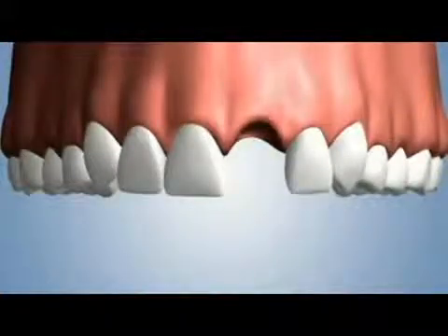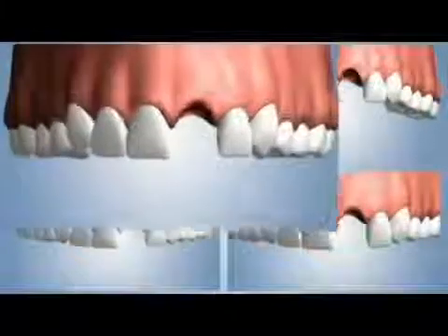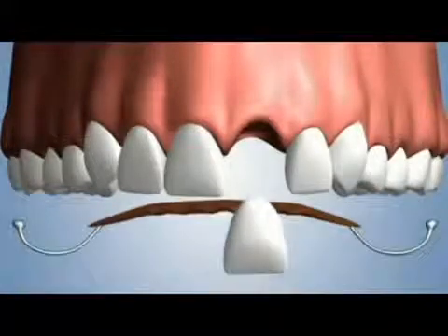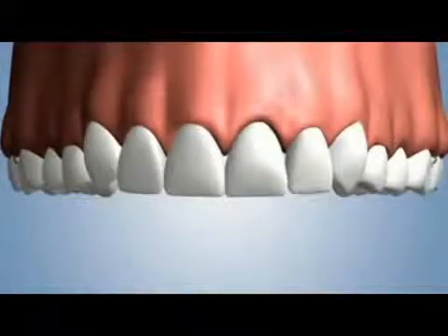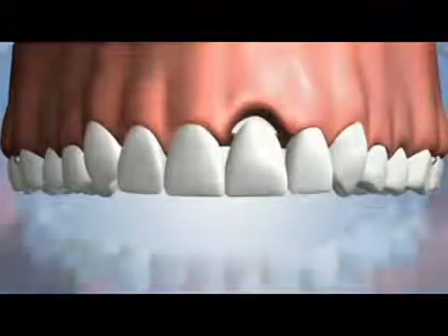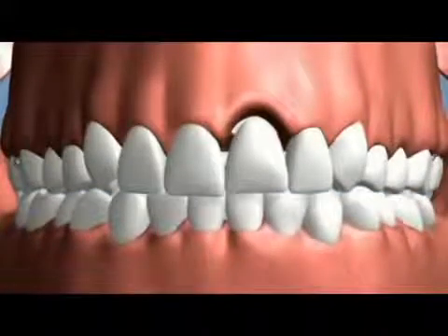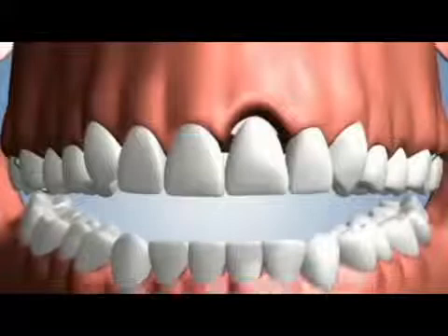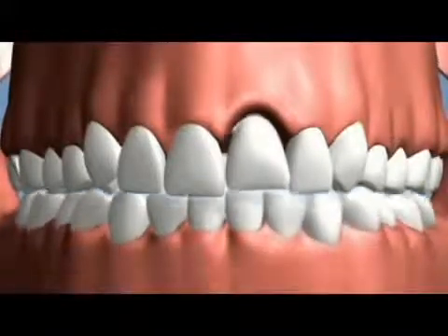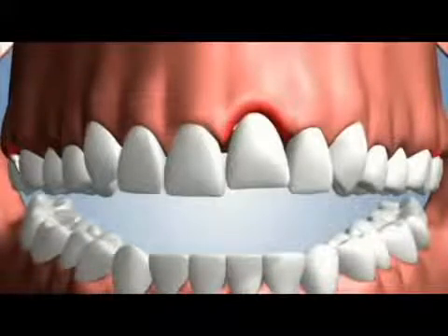If you have lost a single tooth, you have various tooth replacement options to consider. One option would be a single tooth partial denture. A major consequence of this option is the bone loss that occurs due to the absence of the natural tooth root. Biting forces will cause the partial to move and shift because its design lacks a secure connection. Many partial denture wearers may also experience discomfort and gum irritation.